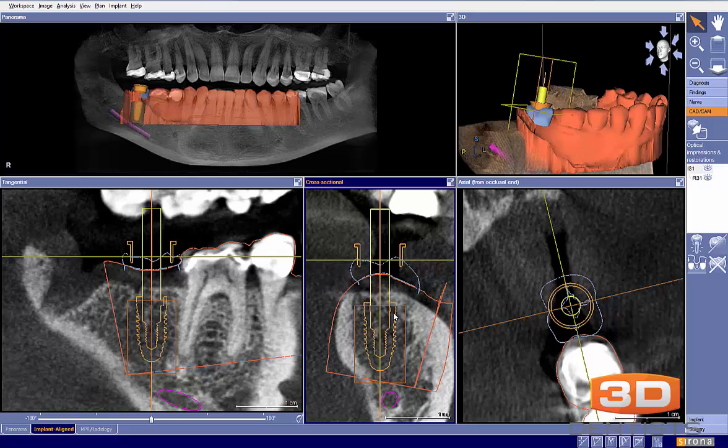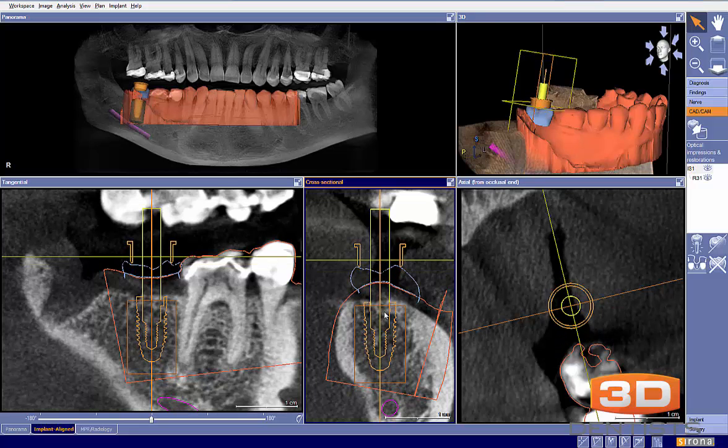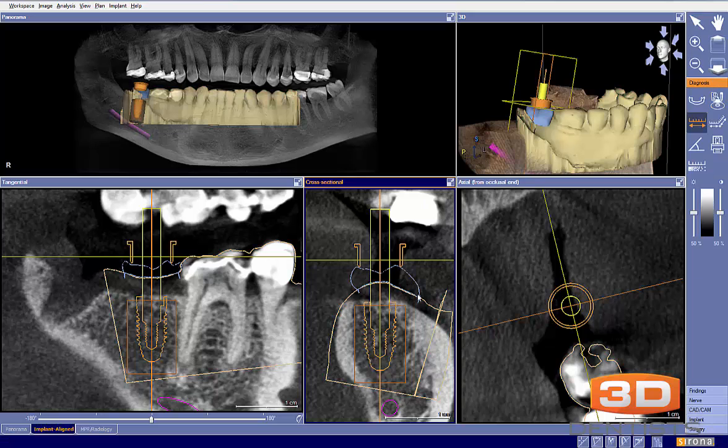Now, how else could I determine the apical placement of my implant? We could also measure. We know that our apical placement should be approximately 3 millimeters, and remember this was drawn too low, so we'll probably say this is our apical length right there. So we know that we want the implant head to be 3 millimeters below.